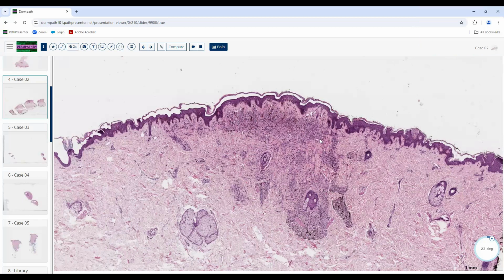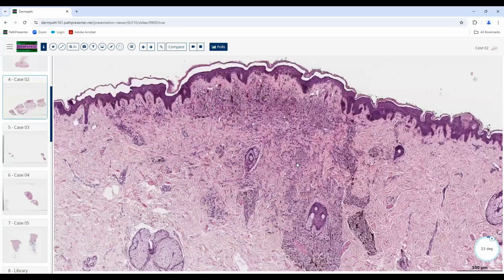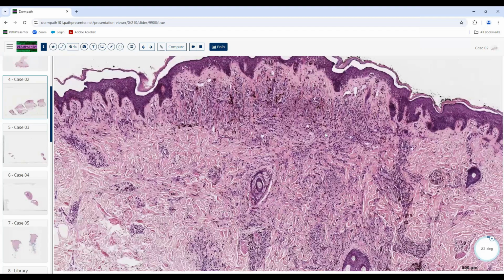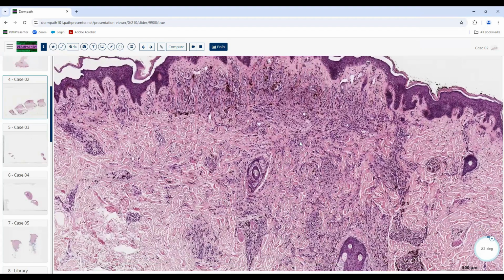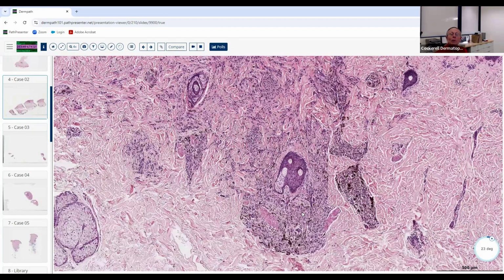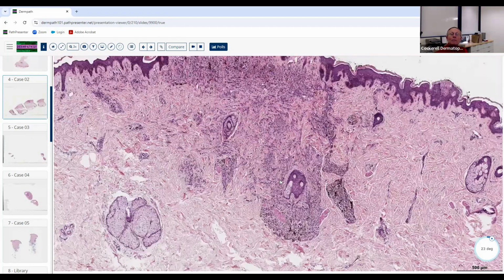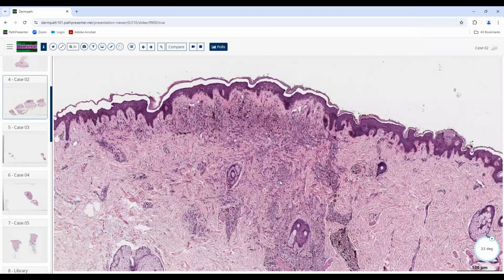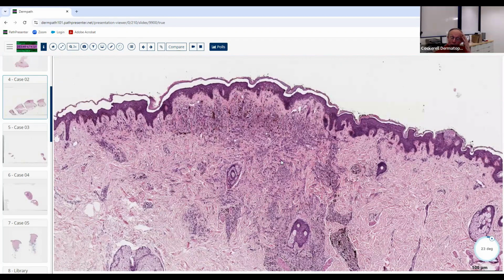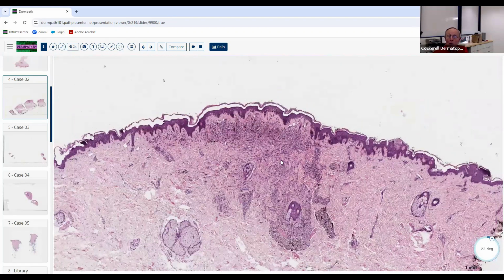What kind of differentiation do you think it is? I think it's melanocytic. Good. There are melanocytes forming nests. So we have two main diagnoses that we have to deal with. There's deep penetrating nevus, but that's getting into the weeds. At low power, we say, is it melanoma or not melanoma? Well, since you've already decided it's more likely benign, it's going to be a nevus of some sort. And then we'll jump into the weeds.